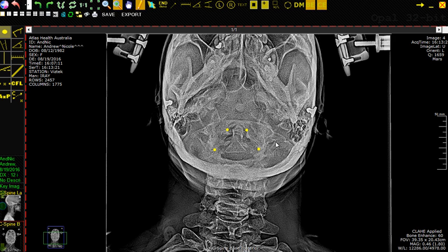So it makes a nice swooping arc as a general rule of thumb, but in some people it's kind of shaped more like this. Other people it's very steep, other people it's very shallow. It goes at any number of different angles, and we have to be able to identify it on the X-ray. Now some docs will use a tool where they can use the mouse and just sort of drag and hold it like this.